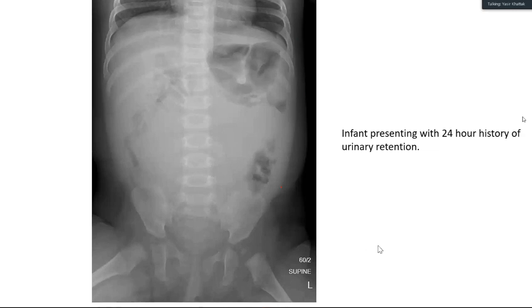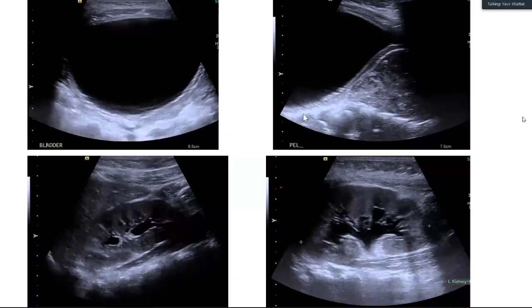Let's do an ultrasound. You see on the ultrasound, you have a distended urinary bladder because we saw that there is urinary retention. You see that both the kidneys are hydronephrotic. And then there is a soft tissue, a mixed echogenicity lesion posterior to the bladder, right? Now this is posterior to the bladder. Now, does it change your differential? Posterior to bladder, yes, sir. It's immature patients, so my differentials include rhabdomyosarcoma. Very nice.